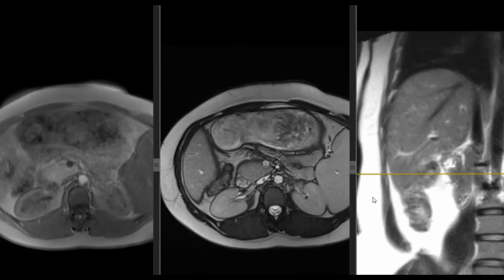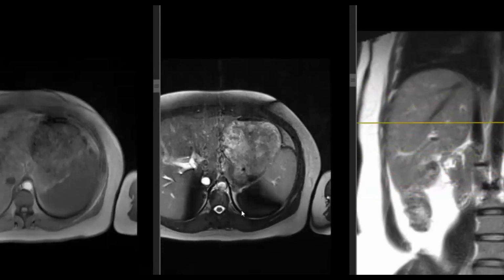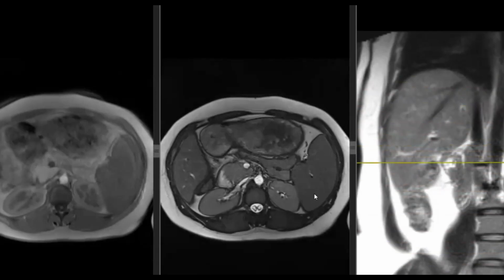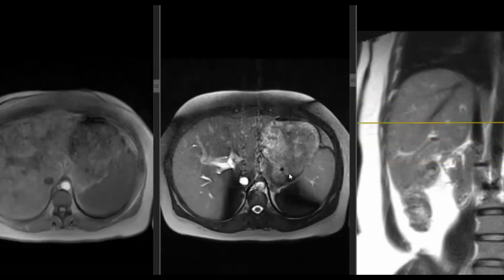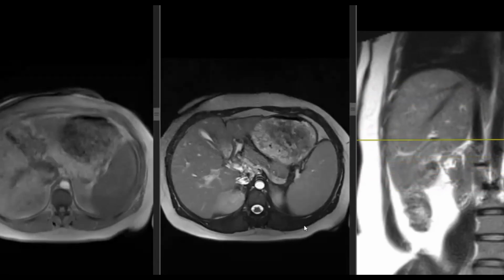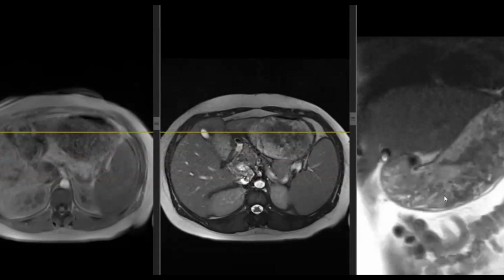So your diagnosis will be trichobezoar, and this is causing gastric outlet obstruction, because the distal part of the bowel is good with no sign of obstruction. No pancreatic mass and no other abnormality in the scan. Again, you are perfectly correct. And this is how trichobezoar looks on an MRI. Usually we see it on a CT scan, maybe on X-ray, though it's somewhat difficult. The distended stomach is prominent, with a mottled appearance, making it look like an anatomical diagram of the stomach.